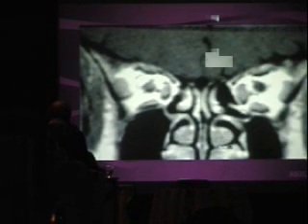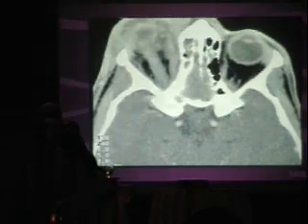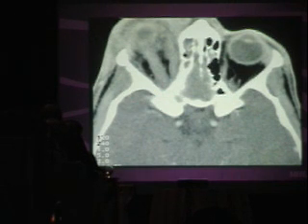This is very treatable. And here's just some asymmetric enhancement in optic neuritis, which is the first presentation of what disease? Multiple sclerosis. And once someone presents with optic neuritis, 80 to 90% of the time, they go on to develop multiple sclerosis.